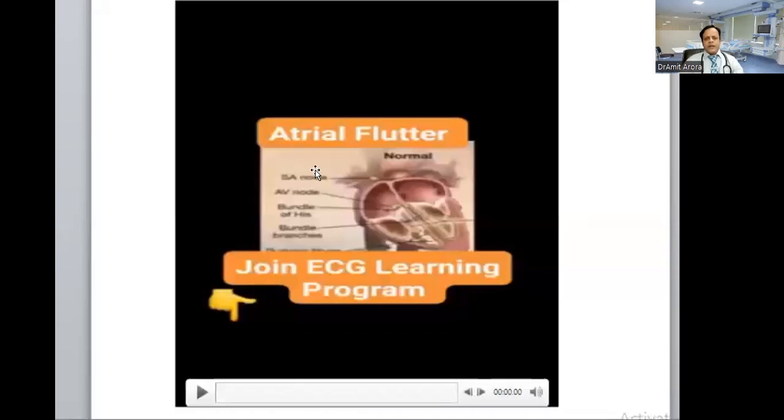Now let us discuss atrial flutter. What happened in atrial flutter? Before going to the flutter wave, let us first understand this. Look carefully at the video at this part. First, there will be normal sinus rhythm. Then this impulse will start rotating inside the right atrium. Let me play this video, so focus on this part and watch carefully.